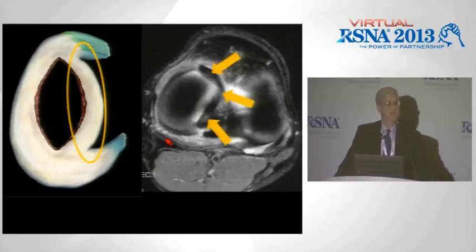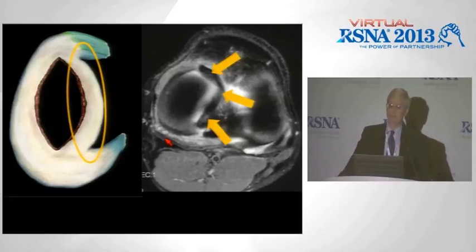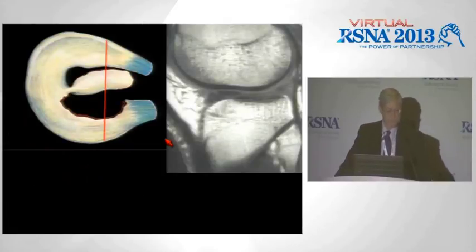Don't forget your axial images. I find them very helpful in many cases, not so much to identify a tear, but in fact to see what kind of tear it is. And usually I think classic signs never look like they were described, but this actually looks like the handle of the bucket displaced into that intercondylar region. You can see the whole thing on the axial images.